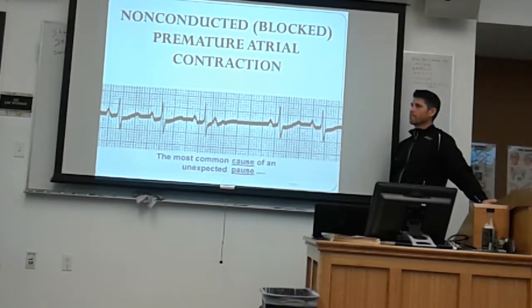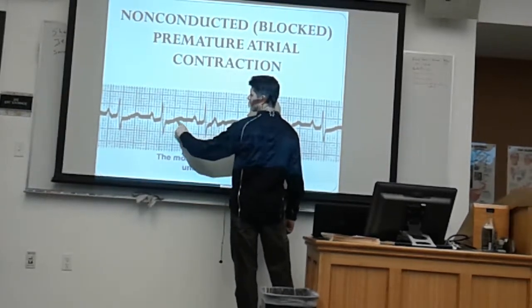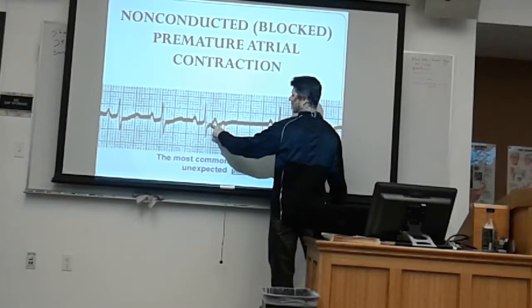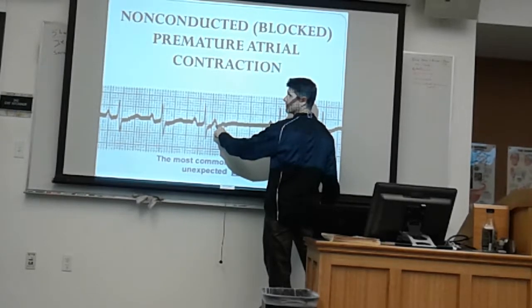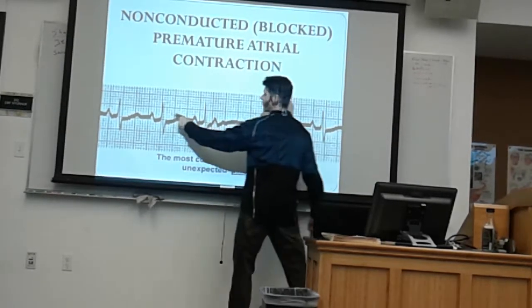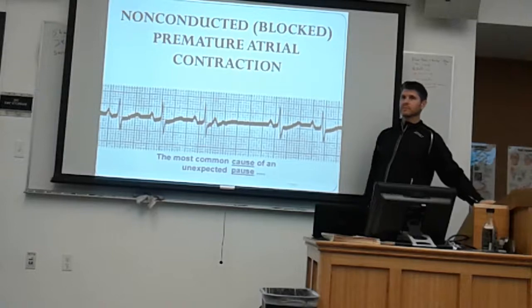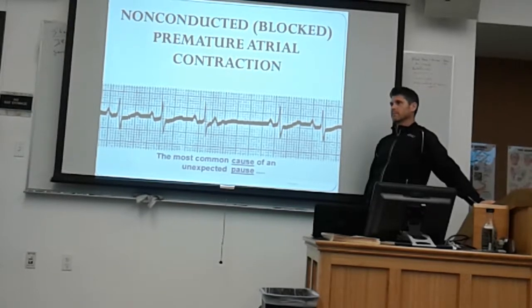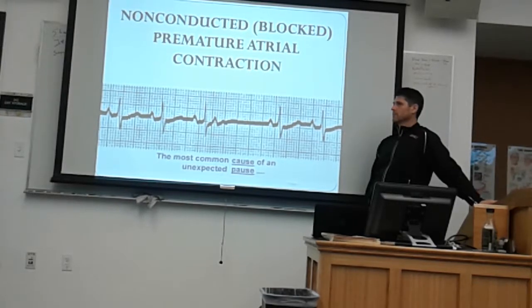So why is that not just your T wave? Because this is what my T wave looks like. This is my ST segment and my T wave. ST segment and T wave. ST segment and T wave. Where's my ST segment and the start of my T wave? It's not there. Something is there though, but nothing is there anywhere else. Something's happening right there. The ST's there, but the P wave covers it, a brighter spot to the camera. So that's all the camera sees. The camera doesn't get to see that ST, it just sees that P. It photobombed it.